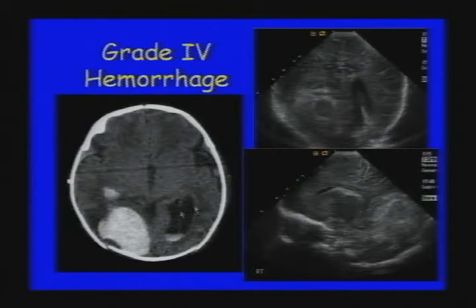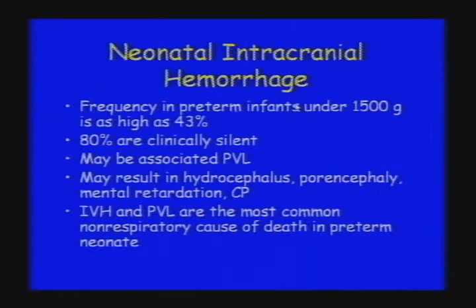Here's another patient that I've correlated the head ultrasound with a CT, and you can see this large acute hemorrhage in the parenchyma. You can also see blood layering in the occipital horn of the right lateral ventricle. Here on ultrasound sagittal, you can see this large hyperechoic mass, and here you can see the mass on the coronal view where there's obliteration of the normal sulci and gyri, and there's increased echogenicity.